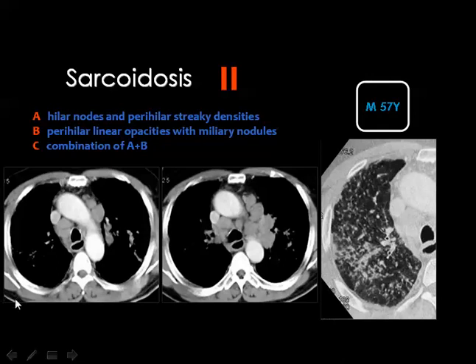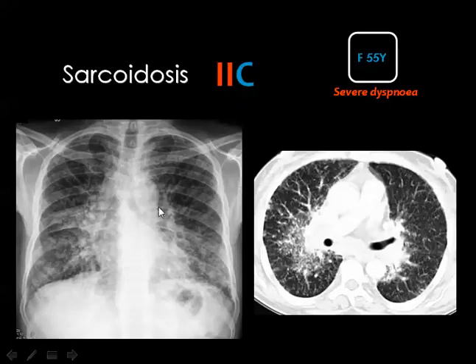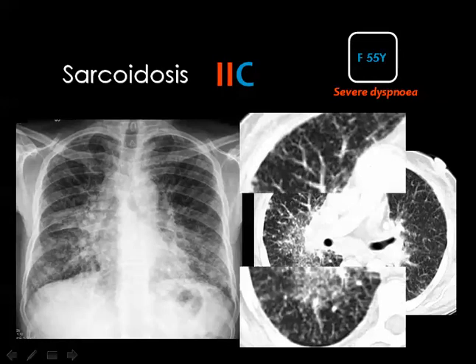Then here you can see the classic appearance of sarcoid lymph nodes in the CT. They are discrete, they are homogeneous, and may contain calcium. The lymph nodes of sarcoid are discrete and homogeneous, do not contain areas of breakdown, and they may contain calcium. This is typical for sarcoid, and you can easily discriminate between lymphoma nodes, which are bulky, amalgamated, and do not contain calcium. If you got opacities in the lung in the lymphatic distribution, you can swear that this is sarcoid. Another appearance of sarcoid: you see enlargement of the lymph nodes and the interstitial opacities of lymphatic distribution, then you call this sarcoidosis.